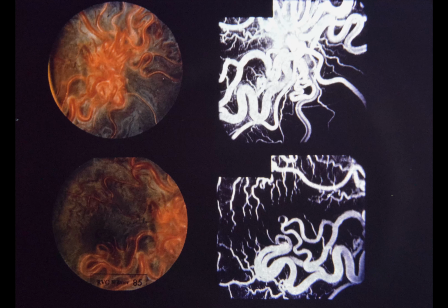Slide 85. Racemose arteriovenous aneurysm of disc and retina. Racemose arteriovenous aneurysm of disc and retina is a rare congenital abnormality. Visual acuity is usually not affected unless the macula is involved. In any event, visual stability is the rule, even though there may be visual loss at the time the patient is first seen. The changes are most often confined to one eye, although bilateral involvement has been reported.